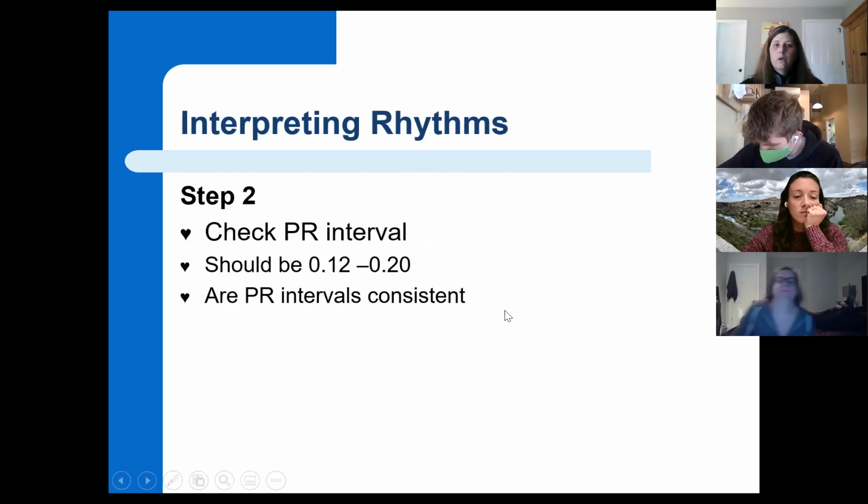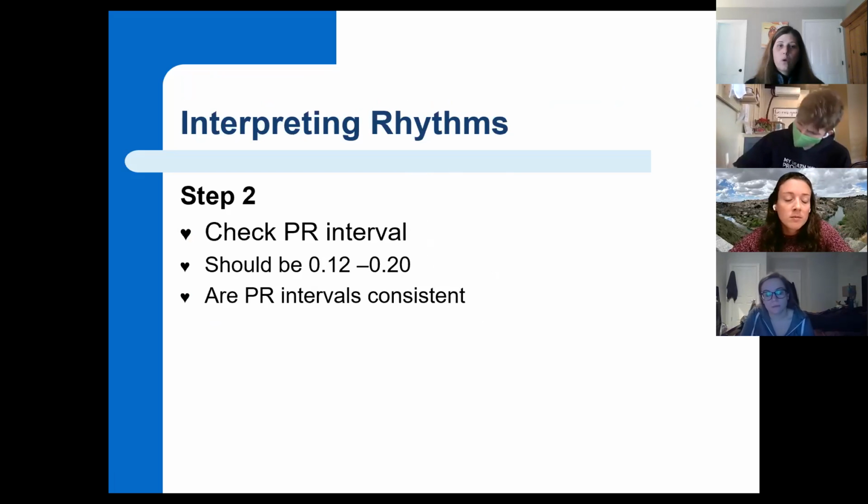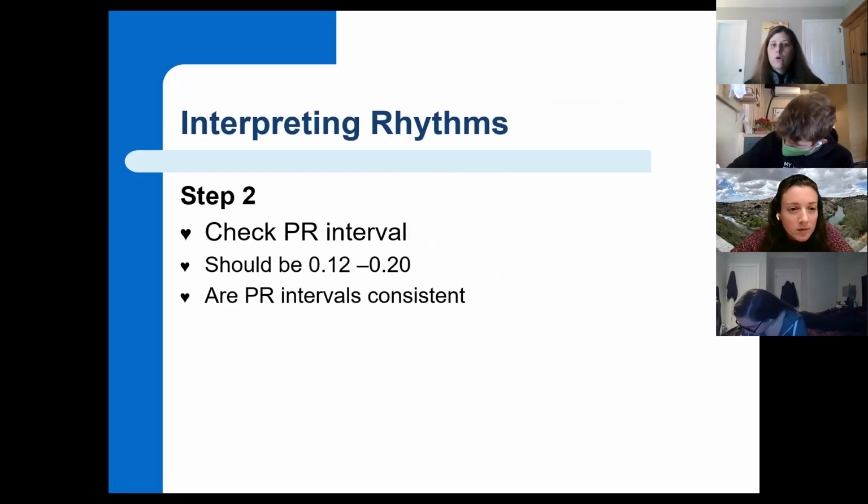Number two, look at that PR interval. Okay? It should be 0.12 to 0.20.